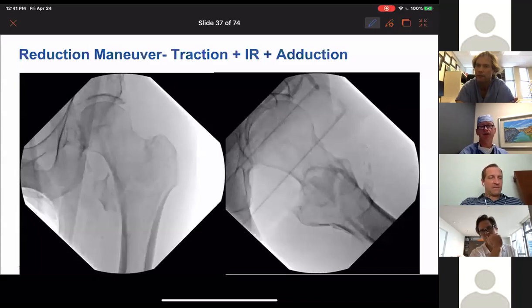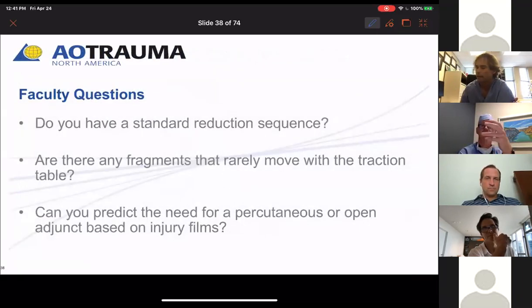I think we have pounded for years on where your start point should be on the AP. And now, with the ones of these that I have to revise, I find that the hole isn't just too lateral, it's also too anterior. That's because they operated exactly on this view and thought they were in the middle, but in fact they were on the front of the troch, right? Yeah, right. That's not changing the bone, that's changing the beam.